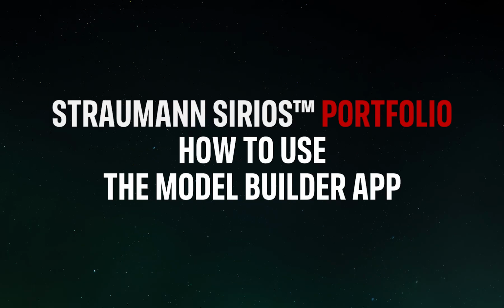Straumann SIRIOS Portfolio. How to use the Model Builder app.